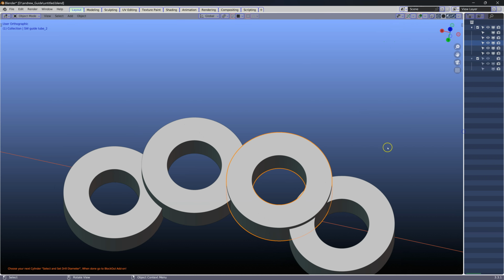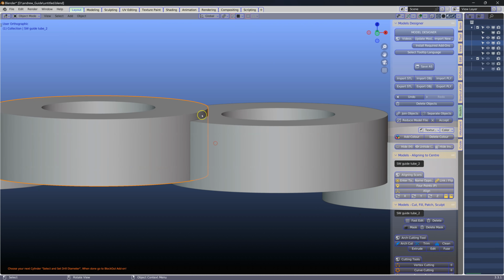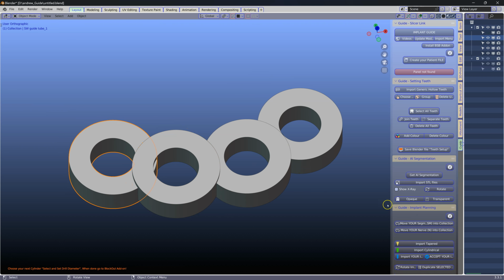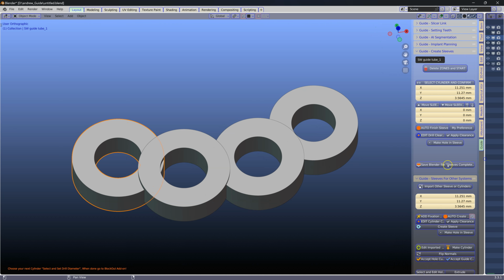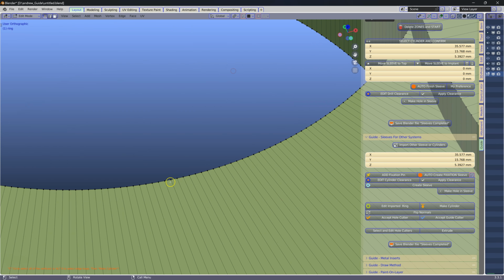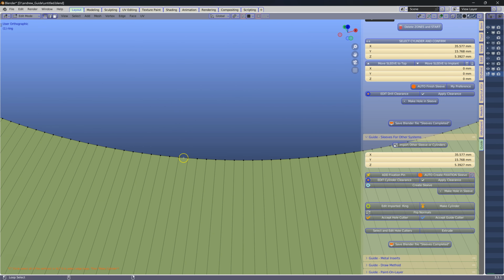Here we are making a guide, and I'll demonstrate how to fix all of these intersections from a different software. Now I'm going to be using all of this data to make a guide in Blender for Dental. So go to the sleeves for other systems. We're going to select them all, and then select the edge loops using Shift Alt left click, and we cover this in our tutorial.